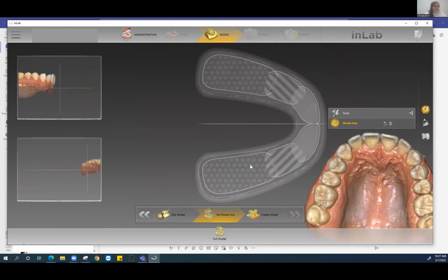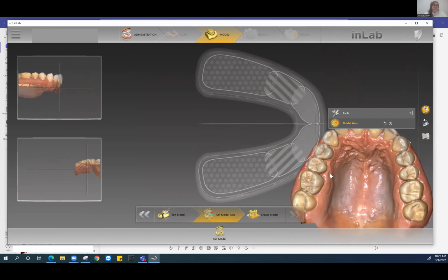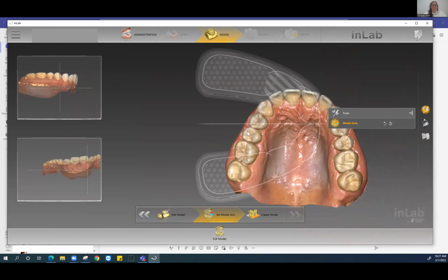You're going to notice this horseshoe here. This is reflecting the jaw itself, okay? Now in this case, it's reflecting the lower jaw. As we know, this is an upper jaw, but just bear with me here. Obviously, in your actual case, it would not show up like this.